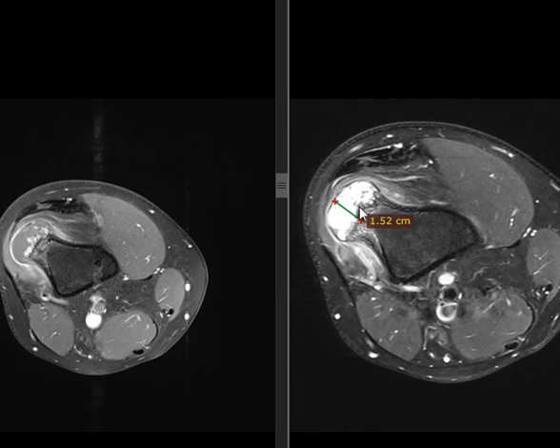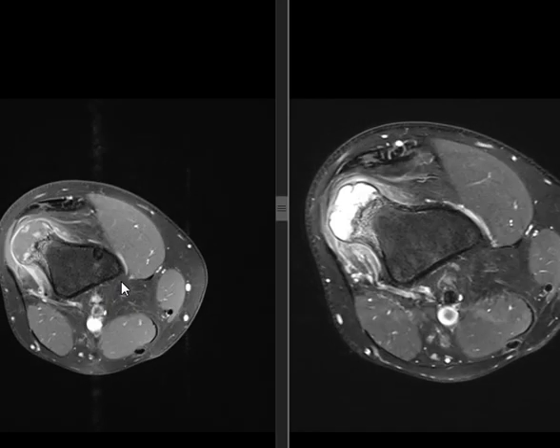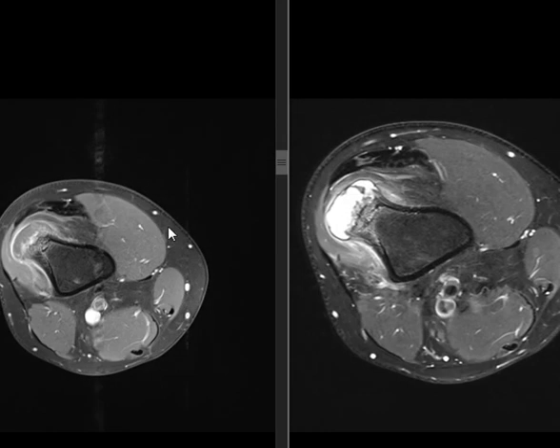Okay, if this was not thick, just osteochondroma and leave it or remove it, whatever you like. But this edema and this thick cartilaginous cap with foci of enhancement, some enhancement of the overlying soft tissue is very worrying. Even it's a little bit displacing the patella to the other side. Okay, good.